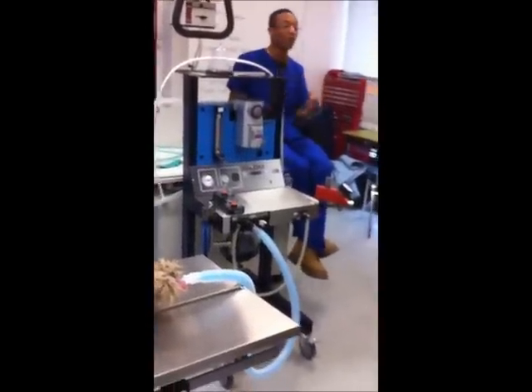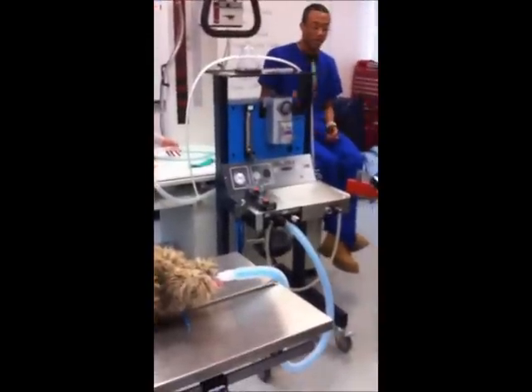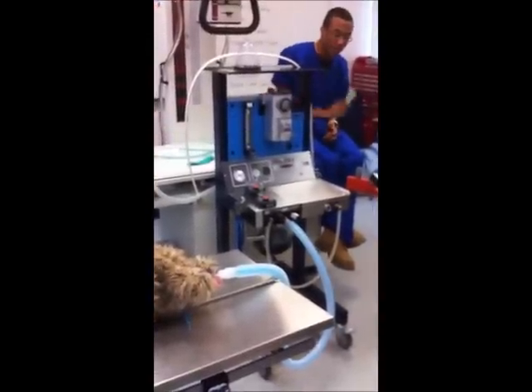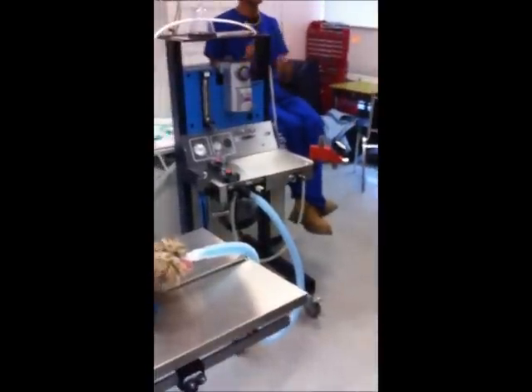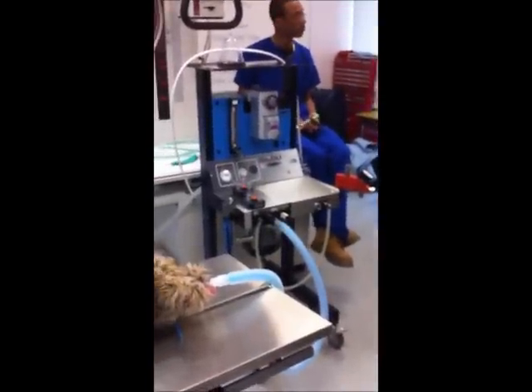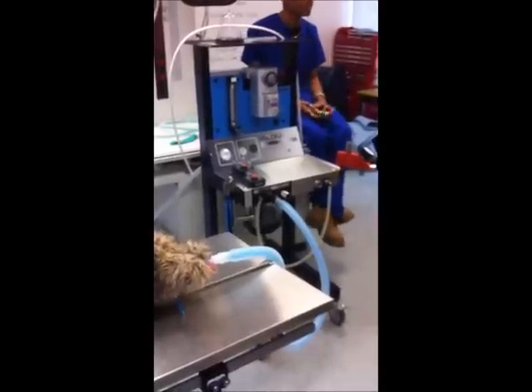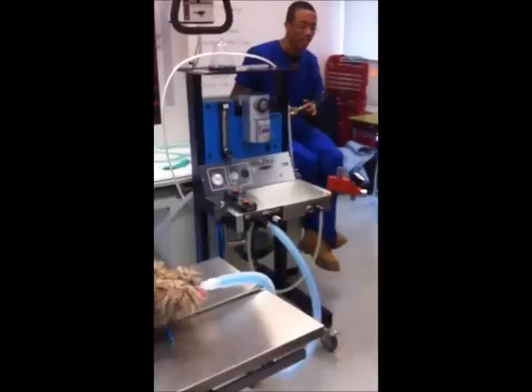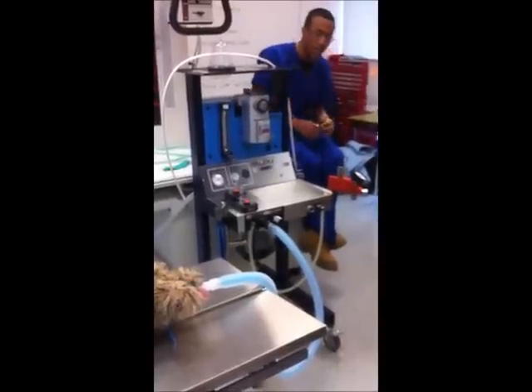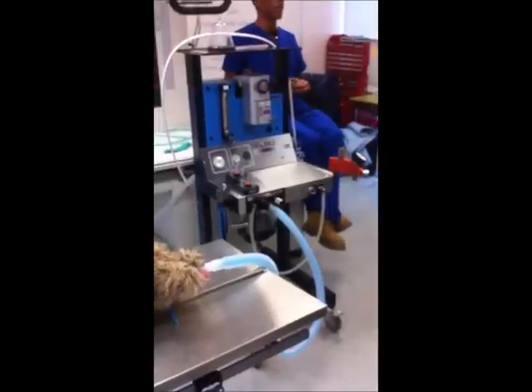Now we're going to continue the flow of gas from the fresh gas inlet port. So from the fresh gas inlet, it's going to be moving through the fresh gas inlet tube. What's the next stop after that? So, where's the next stop after that? From your fresh gas inlet tube, it's now moved towards your rebreathing circuitry. Next stop for that.